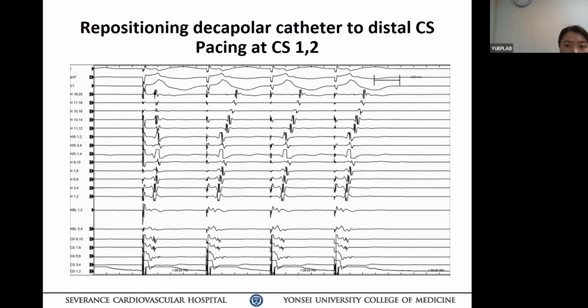Thank you. If you look at your CS activation right now, your pacing catheter, assuming 1, 2, 3, 4, 5, 6, 7, 9, 10, right? Take a look at your EGM in 3, 4, and then also EGM 7 and 8. I mean, 3, 4, you don't see much A. 5, 6, you have a split, okay? And then 5, 6 and 7 and 8 is probably where the split goes out. So 1 is a negative, 5, 6, 7 and 8 is a positive P wave, yeah, right there. So you know that the impulse is spreading through there bidirectionally.